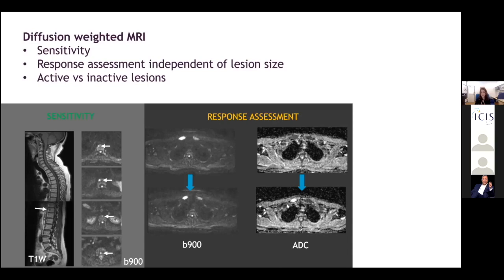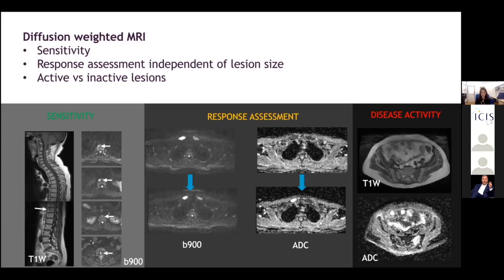And those same principles apply when we restage patients, because restaging is also one of the indications for whole body MRI. And in this patient, who had a slight rise in serum biochemistry, we were asked to re-image. You can see they had lots of focal lesions in the bony pelvis on T1, but again, all had an ADC equivalent to fluid, so they were not active sites.